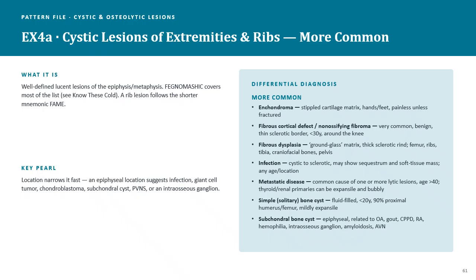Sometimes that's a fluid, or it can also be a softer tissue. Now, as you know, the x-rays pass through that area more easily because it's less dense, so it's going to look darker than that surrounding bone, just like air appears versus how bone appears. Air appears darker.